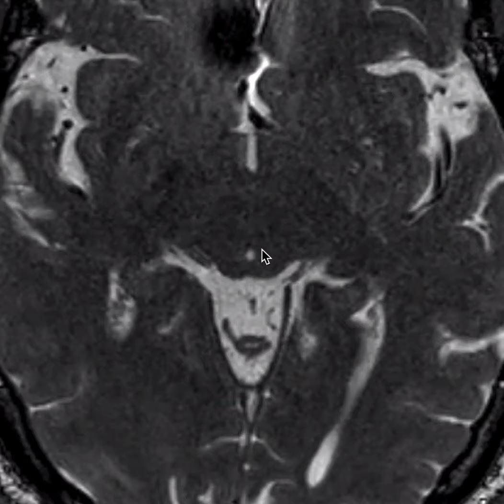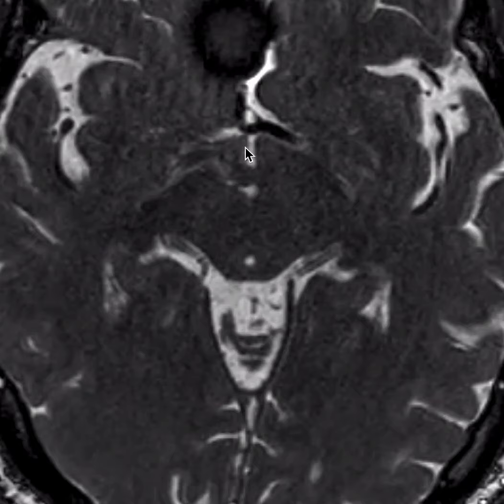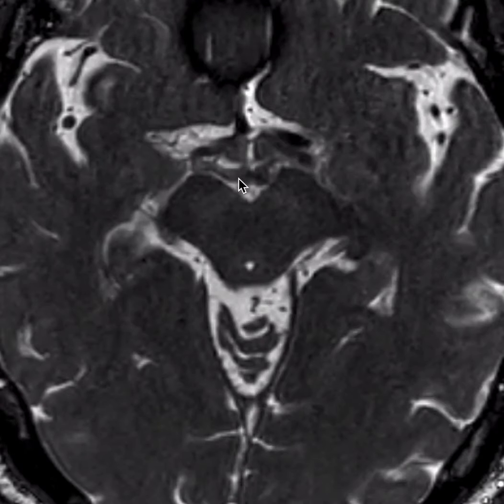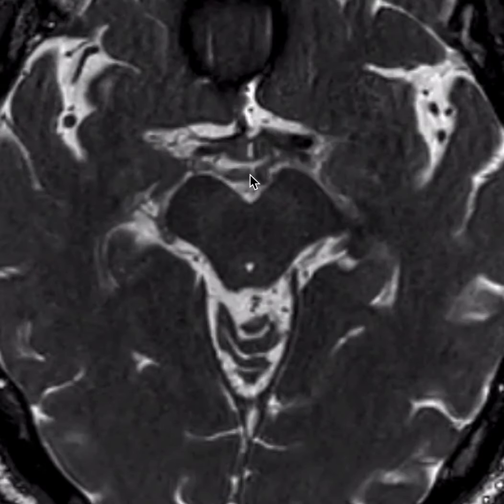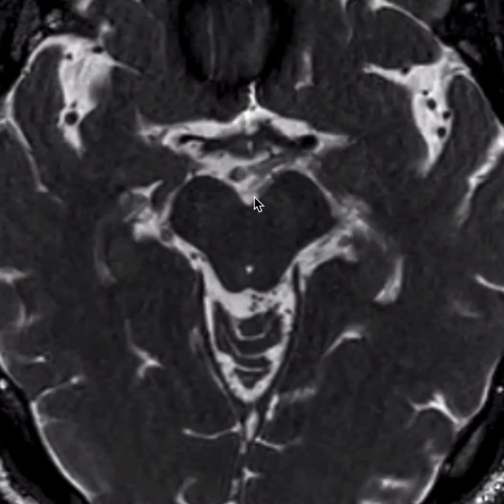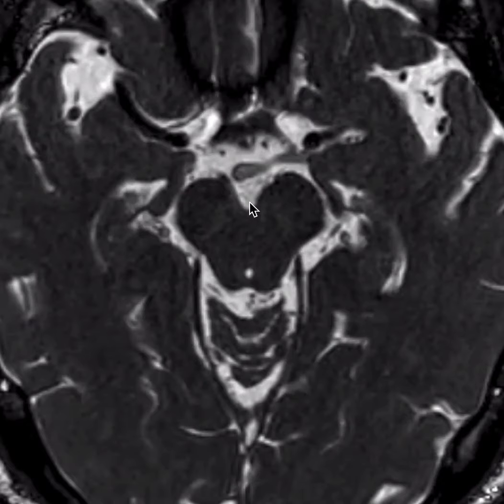The fluid-filled structure back here represents the cerebral aqueduct. As I scroll inferiorly, I'll notice portions of the hypothalamus here, and the fornices as they converge inferiorly as the right and left mammillary bodies. This is the posterior cerebral artery, and here is its contralateral companion, the left posterior cerebral artery. These, of course, represent the terminal branches of the basilar artery seen here. As I scroll inferiorly, I'll notice this cleft of CSF growing and forming the interpeduncular cistern right here.